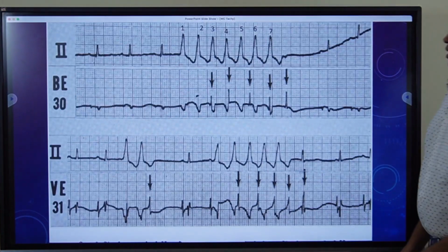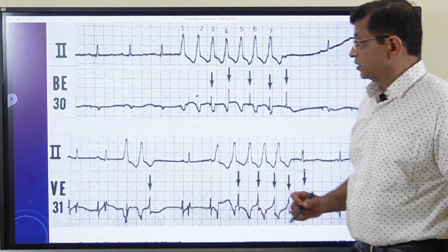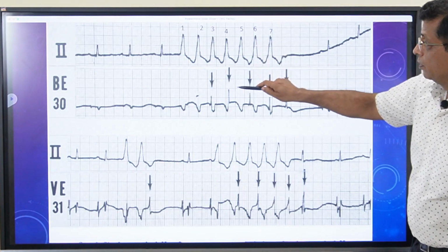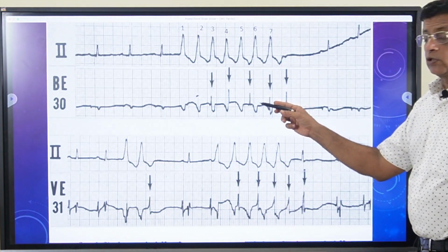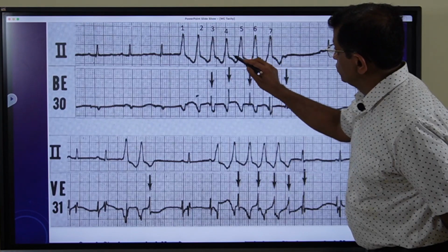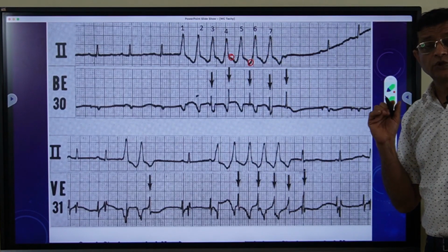This patient was initially in sinus rhythm and developed wide complex tachycardia, and the patient also had an esophageal electrode in place. In the esophageal electrode, the P waves are seen like these spikes. See the spikes here; the P waves were not evident on the surface ECG. Now that you know that the P waves are seen on the esophageal ECG, you can see that this small change in shape was in fact a P wave. But had you not seen this esophageal lead, you probably would not see P waves here. So probably AV dissociation was not evident.